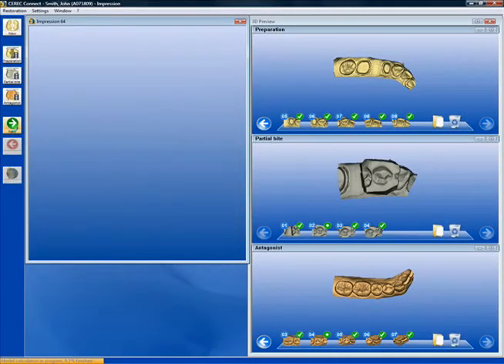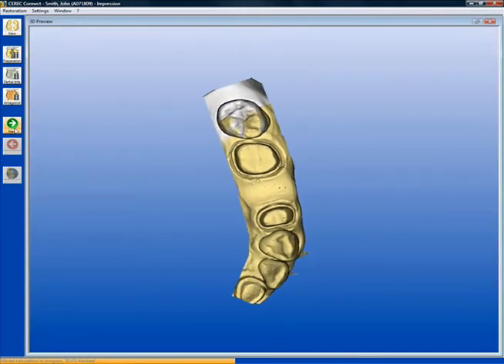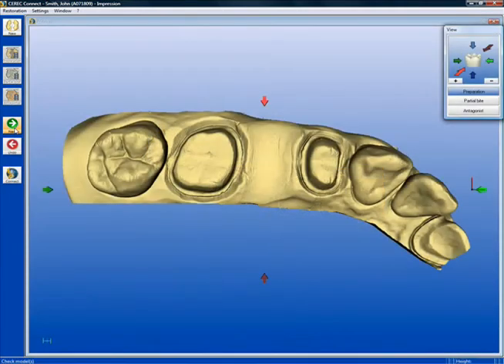Once the camera is deactivated, we can click the green arrow. At this point, the digital models will be correlated and generated in 3D in order to be reviewed, have margins applied, and sent to the lab through the CEREC Connect portal. Once the digital models are generated, we will want to review the 3 models and be certain that these models are ready to send to the lab.